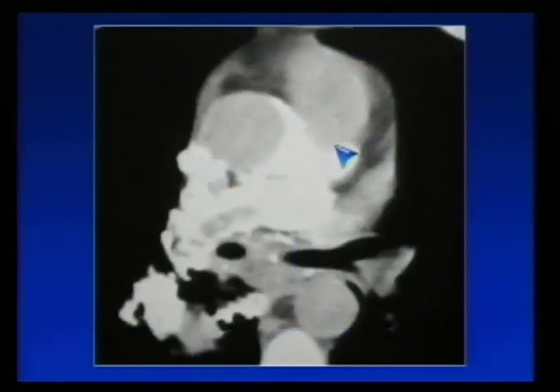Calcification that's infiltrating around. This is all fibrosing mediastinitis. And you can see here, that's the superior vena cava right there. Is that becoming encased and obliterated? I would say yes. This patient also actually had superior vena cava syndrome due to that encasement of the SVC. So this is fibrosing mediastinitis. Doesn't have to calcify this densely, but it typically calcifies and it becomes very invasive and infiltrative.